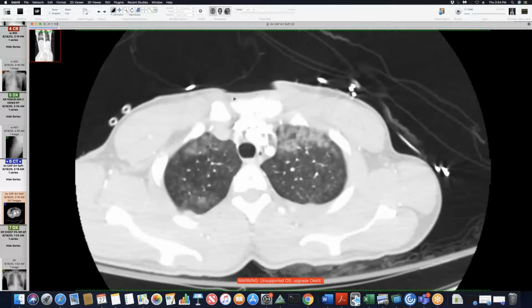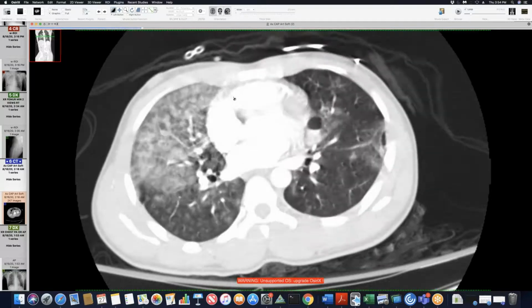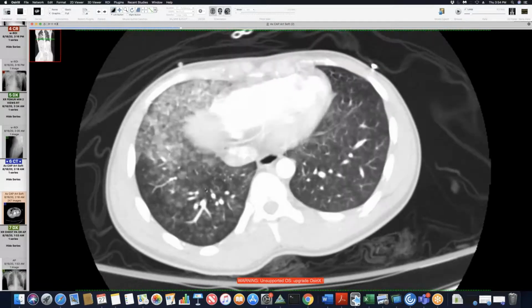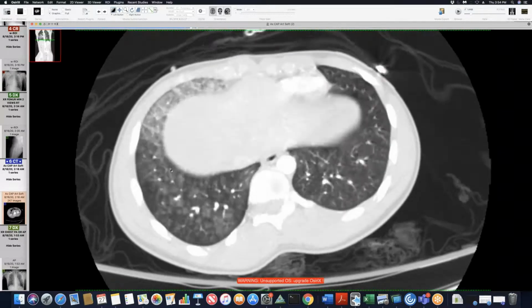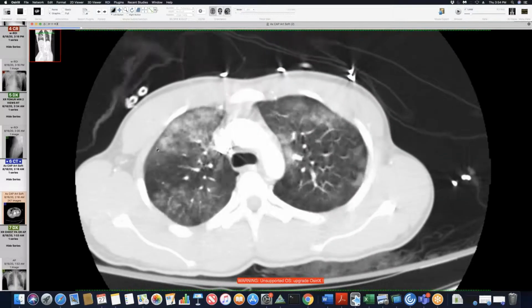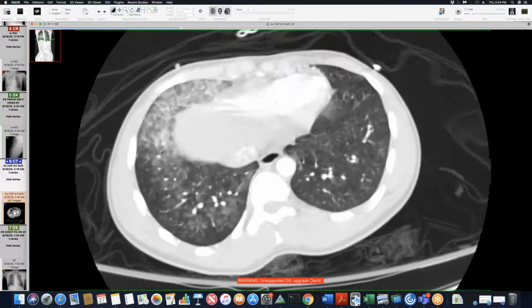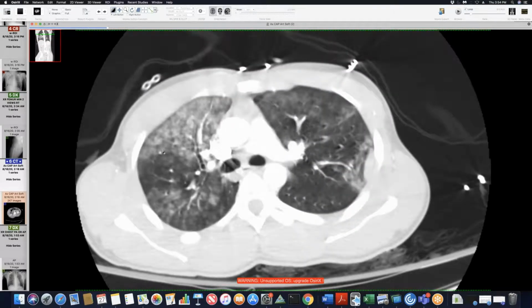And so here are his lungs. And this is a good example of an acinar pattern of ground glass nodularity. And you can see it's very diffuse. There is subpleural sparing. So it's kind of a centrilobular pattern. So that kind of tells you this either came in through the airways or it's a vascular abnormality.